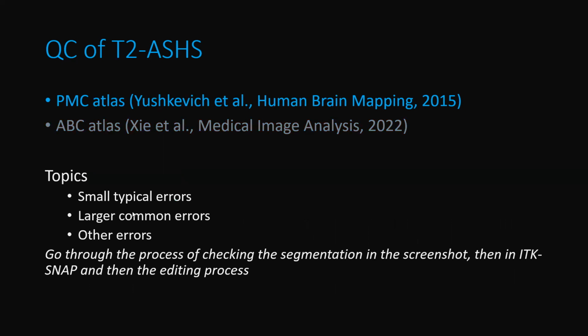So for both atlases, I'll talk a little bit about the smaller typical errors, which are negligible, some larger common errors, and some other errors that I found. And I'll go through the process of checking the segmentation in the screenshots, then in ITK Snap, and the editing process.